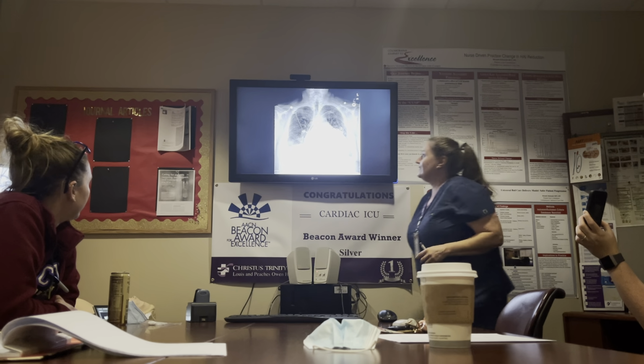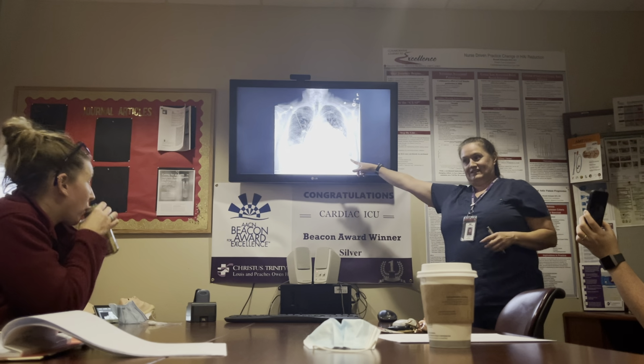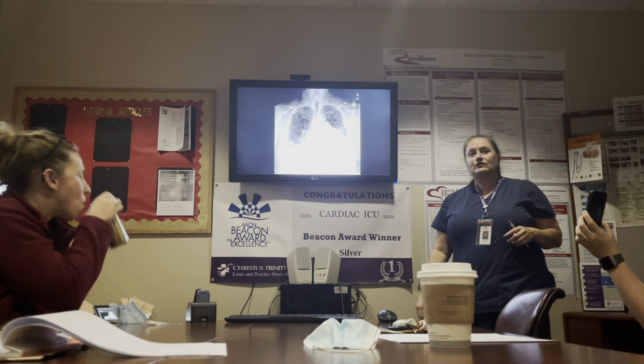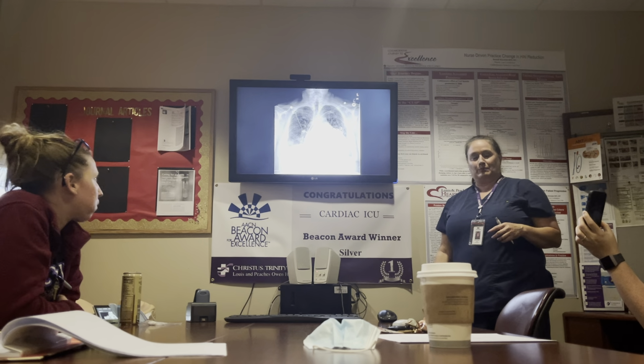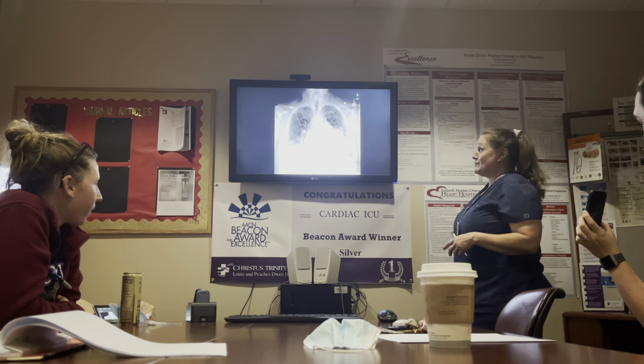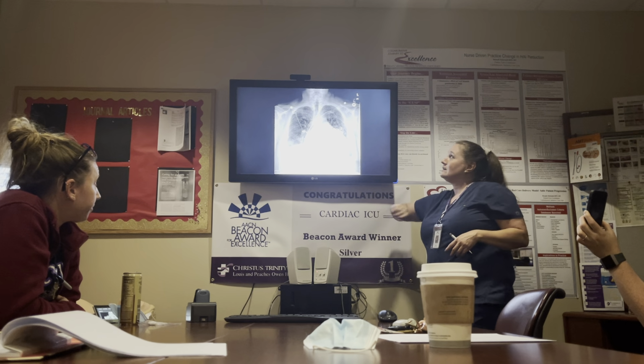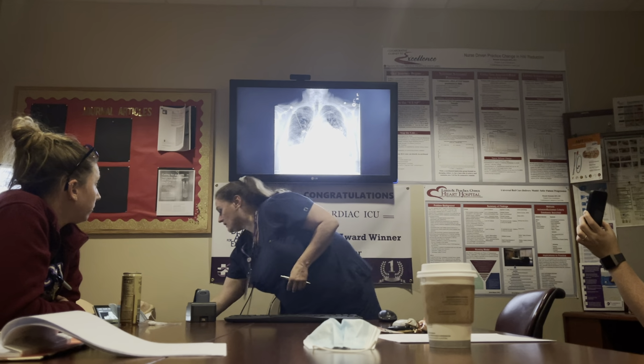What's this? LVAD. Well, there's a pacemaker, but that's an LVAD. Yep. We don't see those out here unless it's the patient that we're shipping off because they already had the LVAD implanted and we're at the stop-off point. But we don't take care of these out here, but that's what an LVAD looks like. Okay.